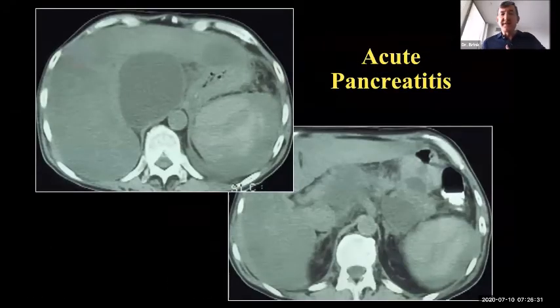Here's another patient from some time ago. This was a patient who also has bad pancreatitis and several fluid collections, but you can see dissection of the spleen. This patient actually fell out of bed, making it somewhat curious as to what the problem was, but there's no obvious evidence of acute blood, and so this proved to be intrasplenic pseudocyst when they debrided the pancreas, but it was a bit confusing given the history of trauma.